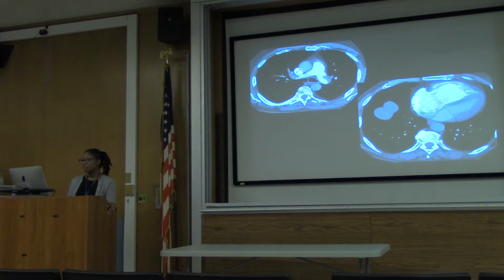So I have like 3 more cases to show you, then you guys can get out of here. And this is something that we see quite often. What is this? This is a PE, bilateral saddle emboli.